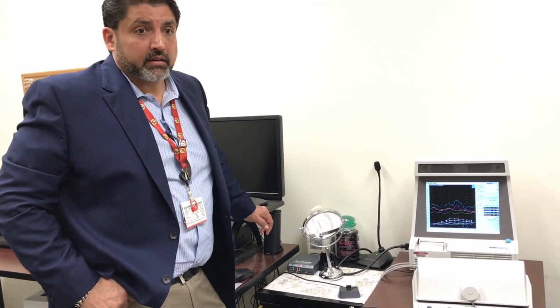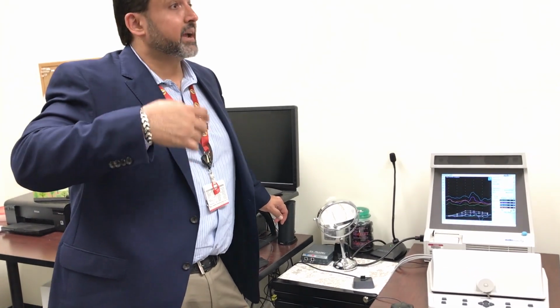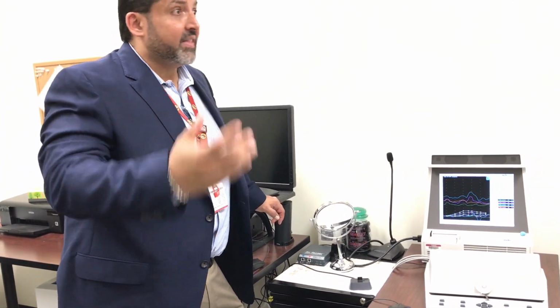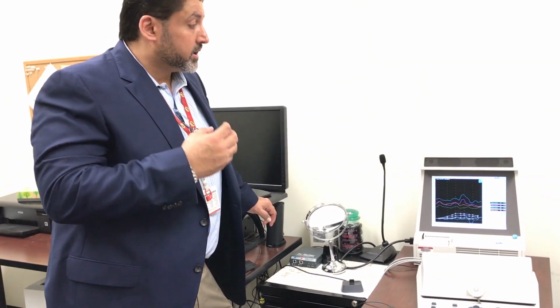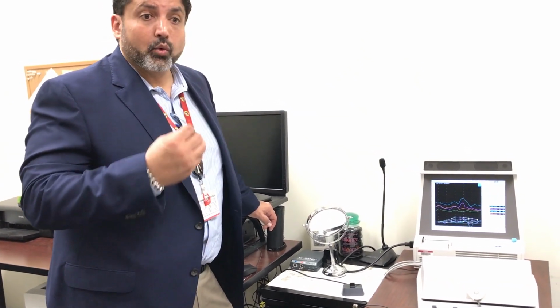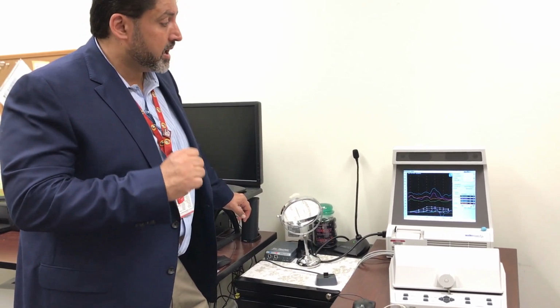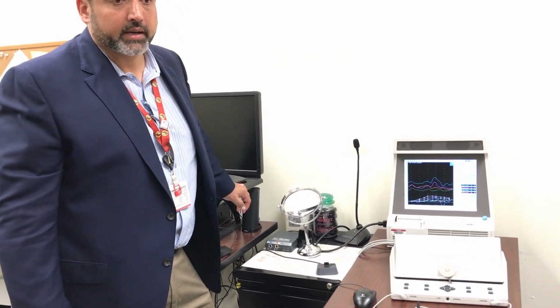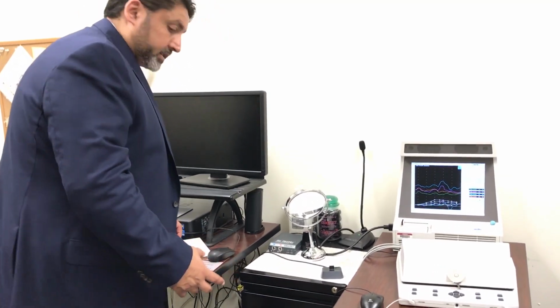So if the patient says to you the hearing aid is very, very tinny, and you decide just to reduce the compression ratio in the highs, the patient says it's comfortable, then that's what they want. That's what they like. That doesn't mean it's a bad fit. So use target as a relative term to help guide where you need to go so that you're not over amplifying. It's not an absolute. A lot of clinicians believe that this is an absolute, and it's not. Okay? So that's the second piece of this.